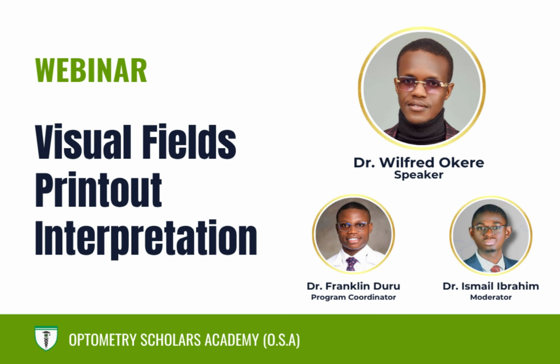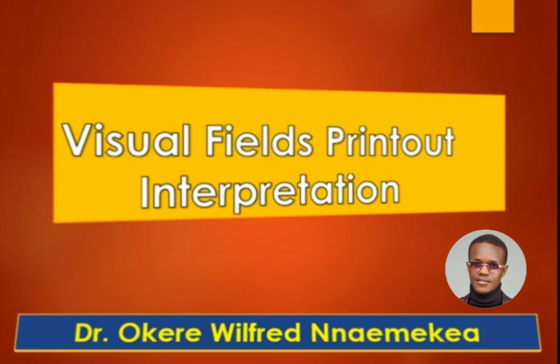So today we are looking at visual field printouts and their interpretation as well. So please, I would love you to listen attentively as we proceed.